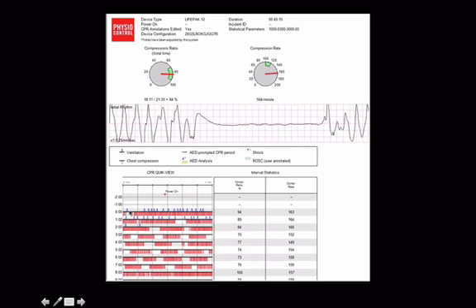Here's an example of what the ventilations look like. And again, these are not quite as reliable, and we don't use these the majority of the time. You'll see on this resuscitation that compressions were happening much too fast to allow effective filling of the heart. And again, you can see minute by minute trends of that.